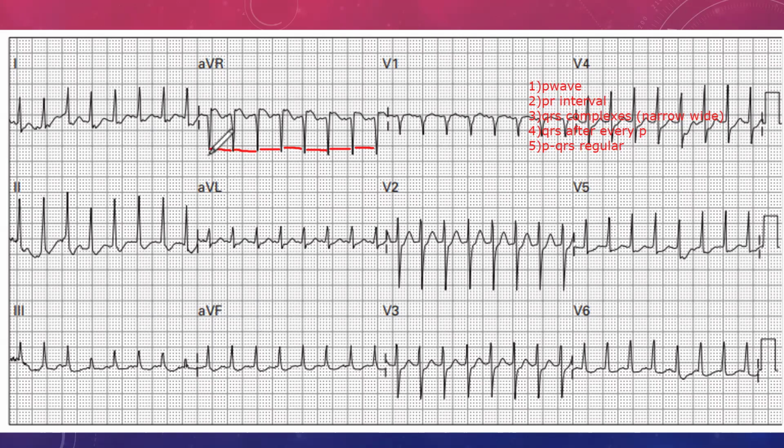So in other words, to have an absolutely regular heartbeat, where it's not changing no matter what, is also abnormal. Okay. Does anybody want to venture a guess as to what our patient may have? Our patient has come in with palpitations, all right? Our patient has come in with a very, very regular heartbeat.